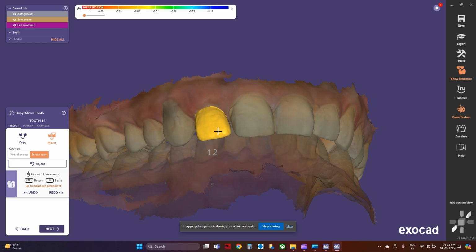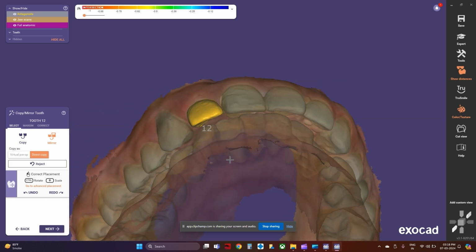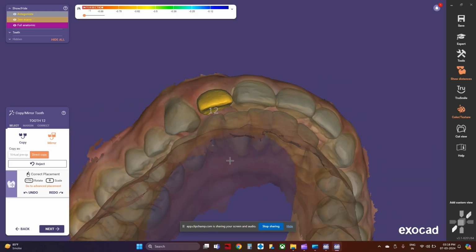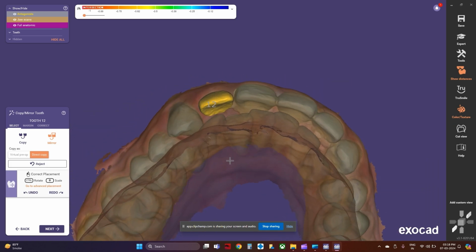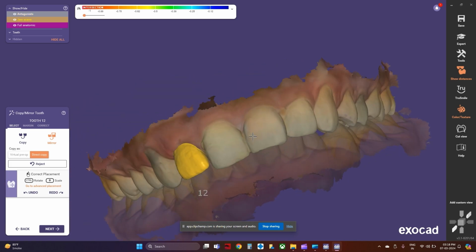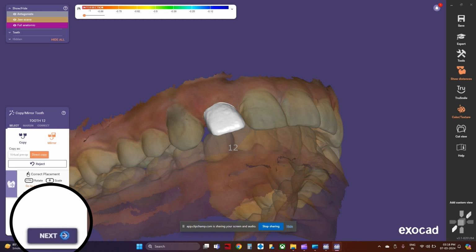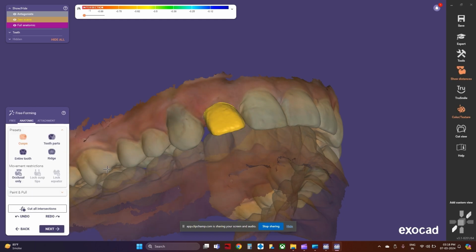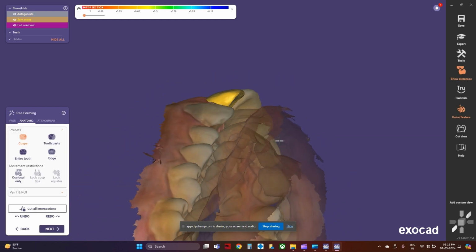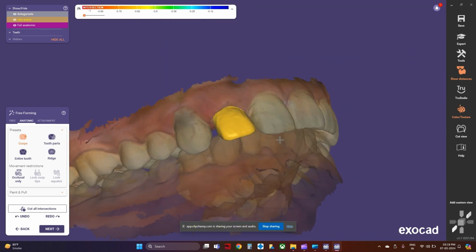Okay. This looks doable. Let's hit next. Unless we want to make some changes over here, we make those changes.